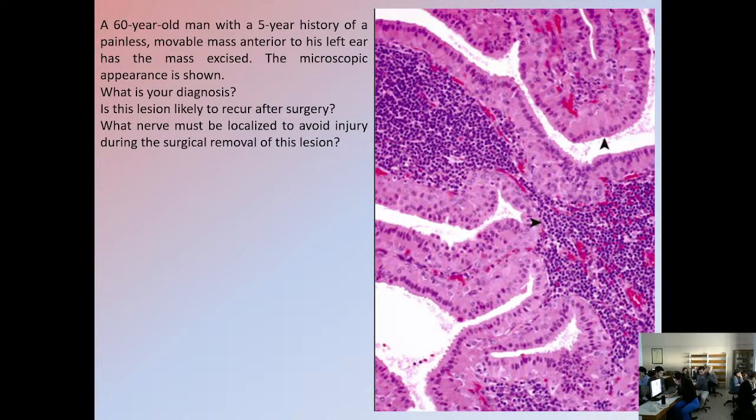What is this pattern in a tumor? You have covering cells, here oncocytes, and a stalk with vessels, capillaries, and in this case, dense lymphocytic infiltrates. What is this called? Some glandular tumors have this pattern. Glandular tumors do not always form glands. Sometimes they form these structures. What is this called?